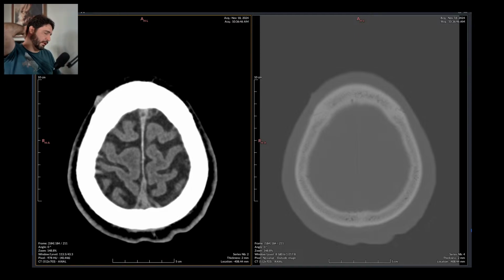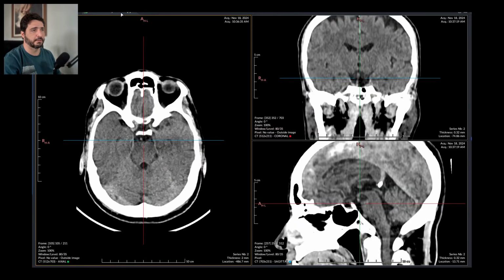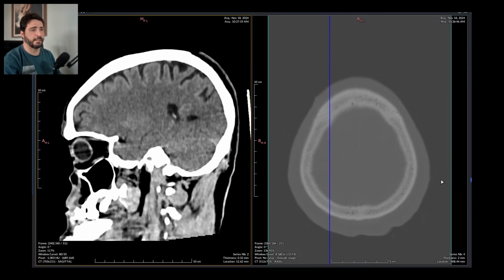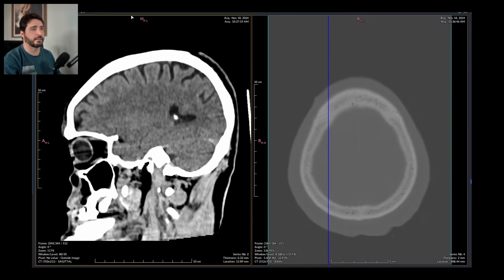Those mesial temporal lobe coronal sequences, you scan just like this. This is a CT scan, but it's just anatomy, right? So you go like this, and you do a scan just like this. You go from here to right about there, like this.